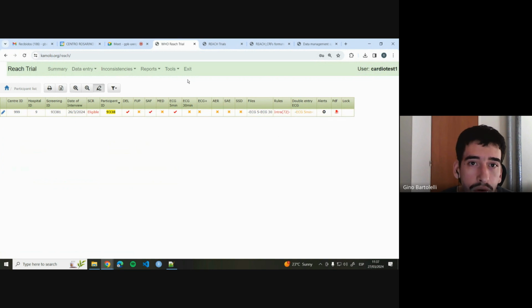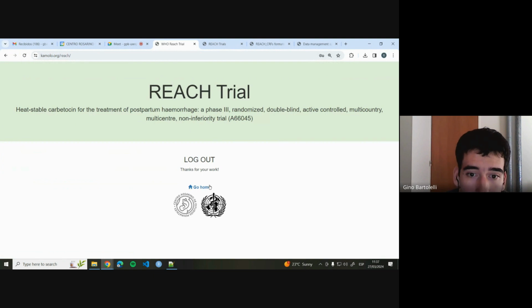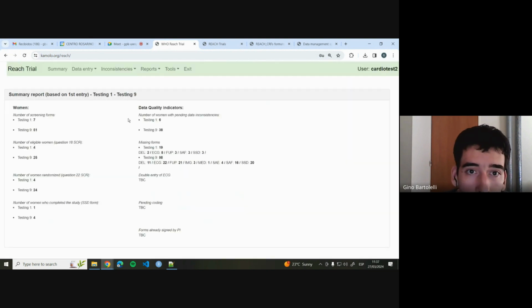Okay, so I'm just going to log out. So instead of cardio test 1, it could be cardio test 2. Okay. Now I am logged into the system as cardiologist number 2.